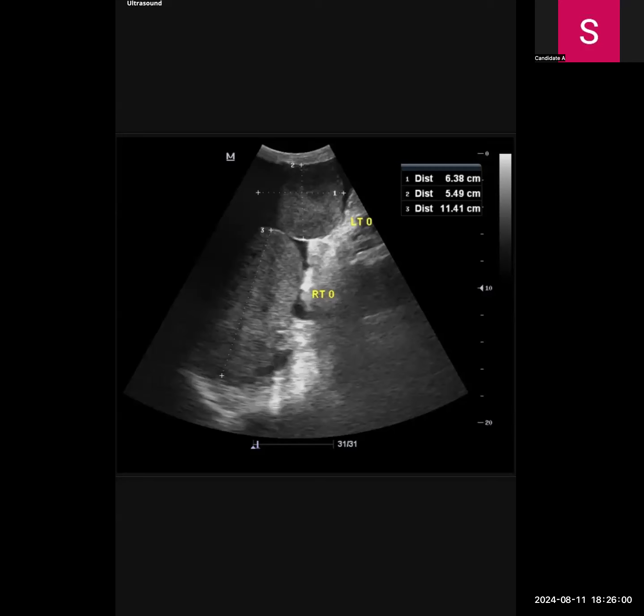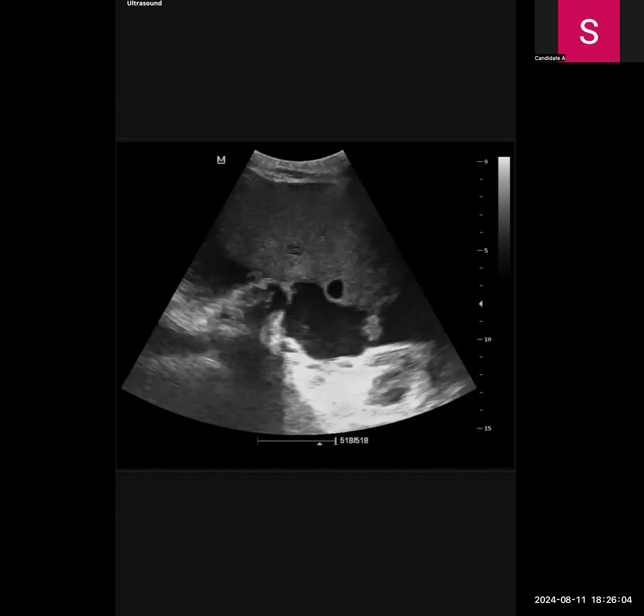Also, in the later images, I saw there was ascites with adjacent fluid with echoes and some irregular areas of probably fat stranding and some irregular lobulations. These could be deposits. So in my routine practice, I would also put some color Doppler on these masses and see if they take up any color flow.